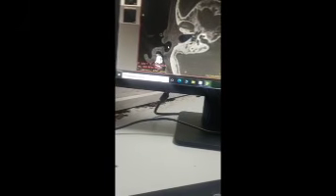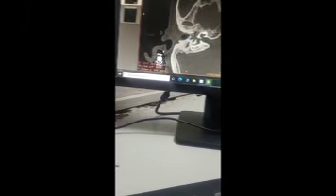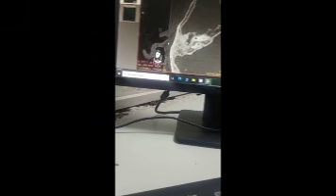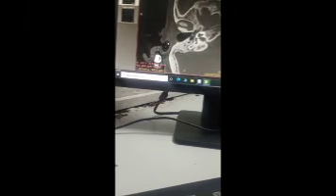Here you can see that we are going inward to the external auditory canal. We look at the external ear, its shape, its prominence, any mass, any deformity. No mass is present. Now focus on the external auditory canal, as indicated by the arrow of my mouse. As we go downwards, you can see the external auditory canal, and the structures of the middle and internal ear have started to appear.